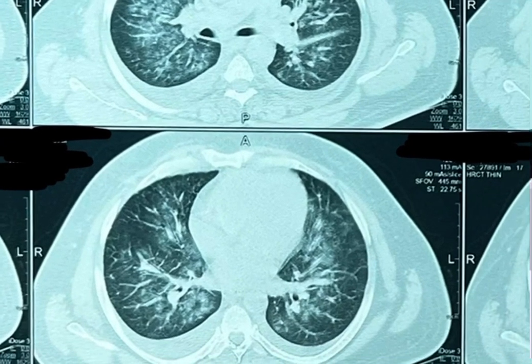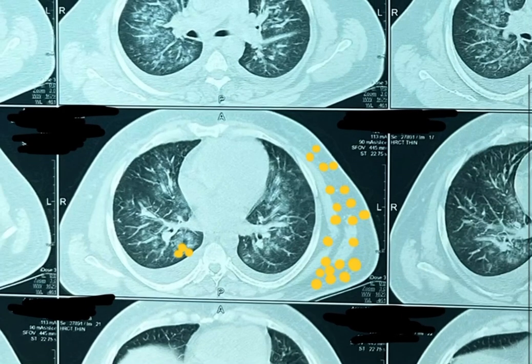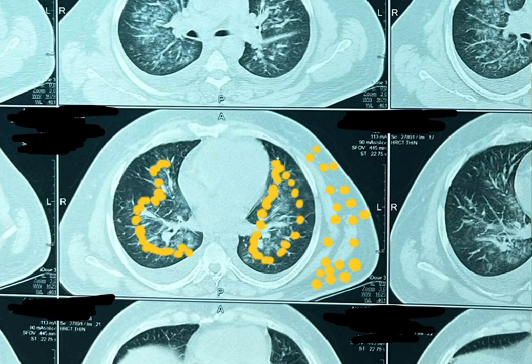whitish, or what we can call hyperdense nodular opacities. Nodular in the sense you can see the nodular opacity will be like these dots. So this type of dots, what we can very clearly see is here. So there are very fine, thin dots or nodular type of structures, especially involving this area. This is the area where it is involved.